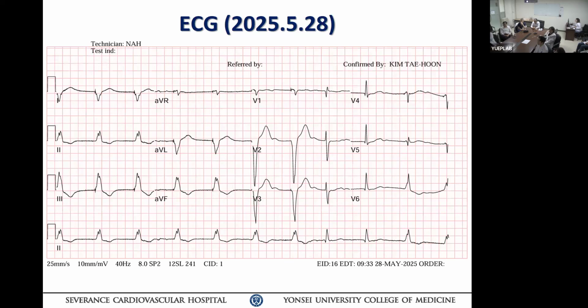No, it's isoelectric. Right. So if this was a CSP, then you need to revise the lead. Not good. They have to reposition the lead to get proper pacing. But if this is a regular single chamber pacemaker, then you will be satisfied with the capture threshold and sensing, and then you're done. Okay?